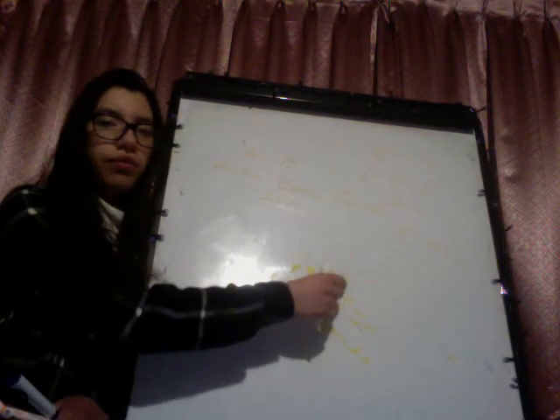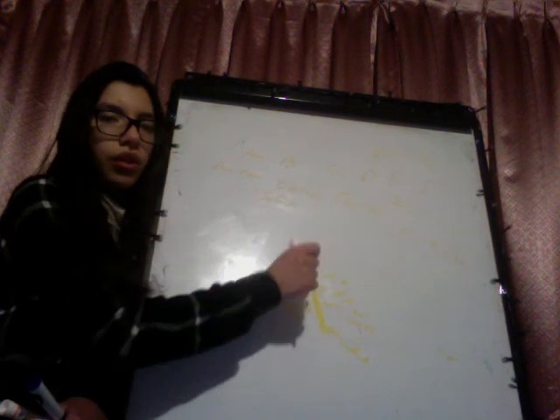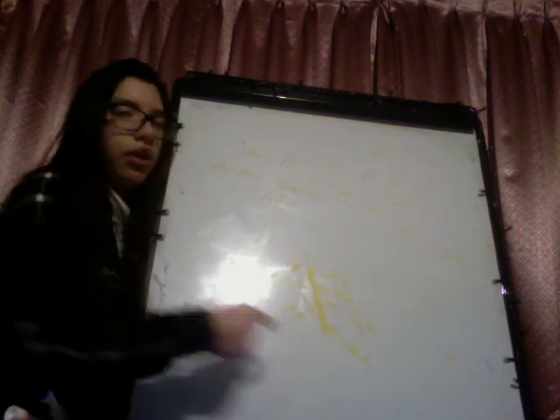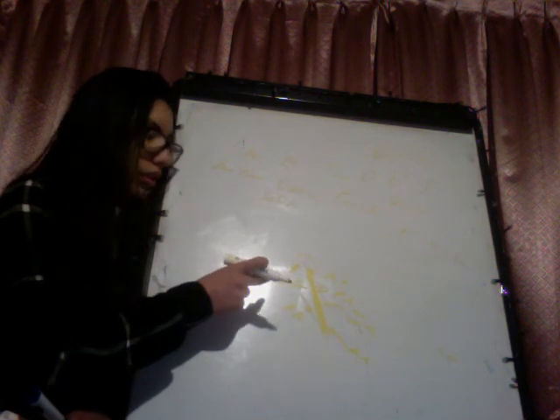So in the left is aorta, aortopulmonary window, pulmonary artery, left atrium, left ventricle, descending aorta. Right, ascending aorta, pulmonary artery, and right atrium. We will see it like this.